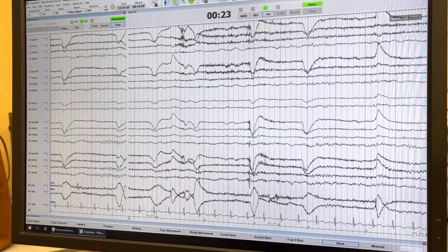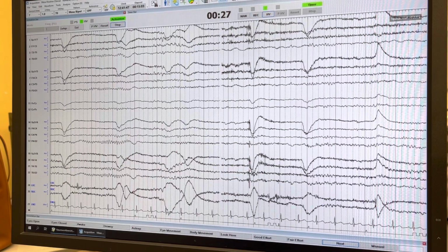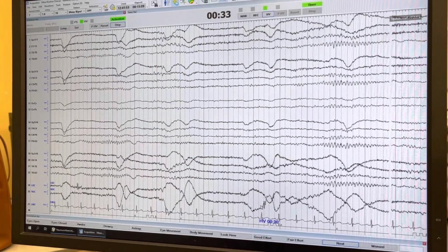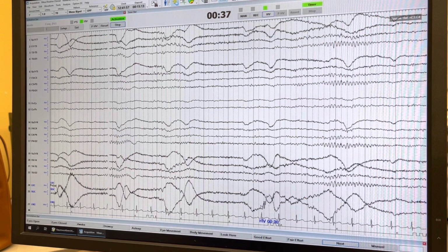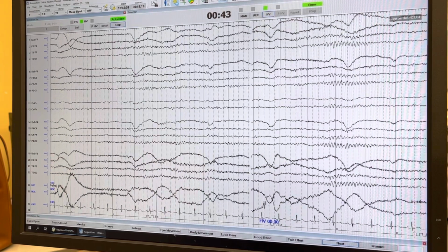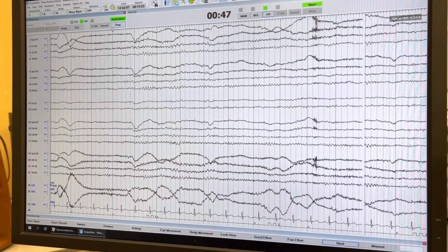It'll say 30 seconds, then a minute, and a minute 30. Here, it says 30. It'll mark it for you every 30 seconds. We'll go to about a minute, and then we'll just stop it.